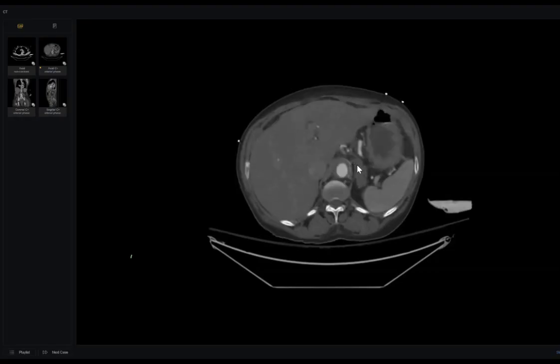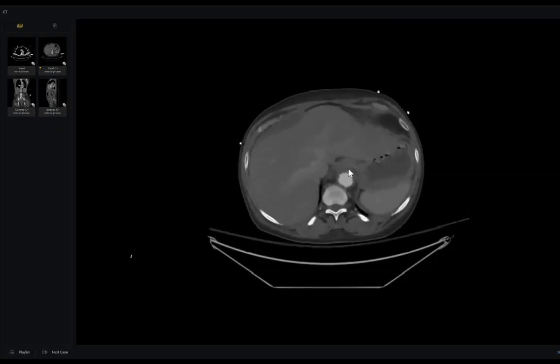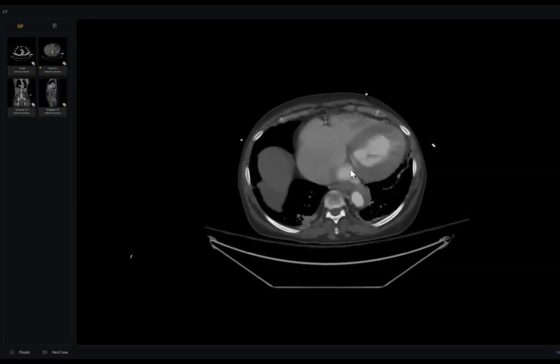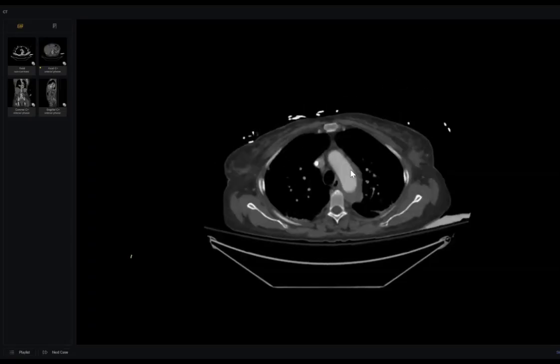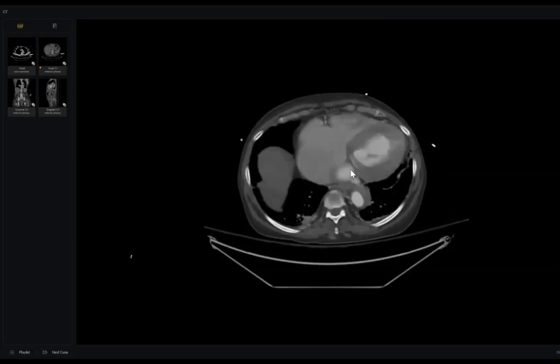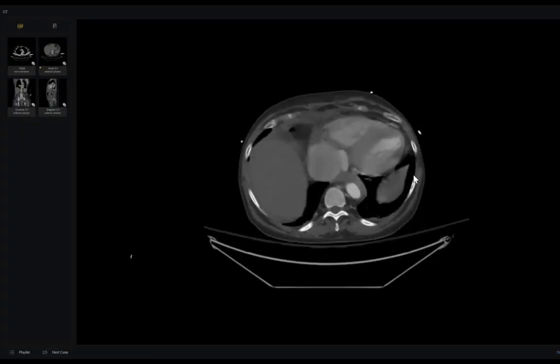This really reminds us of the changing position of a dissection, but we can't find any contrast here. And the patient has acute chest pain, okay? So have another look. Oh, doctor, we find some contrast here. What is this? Connect both findings with each other.